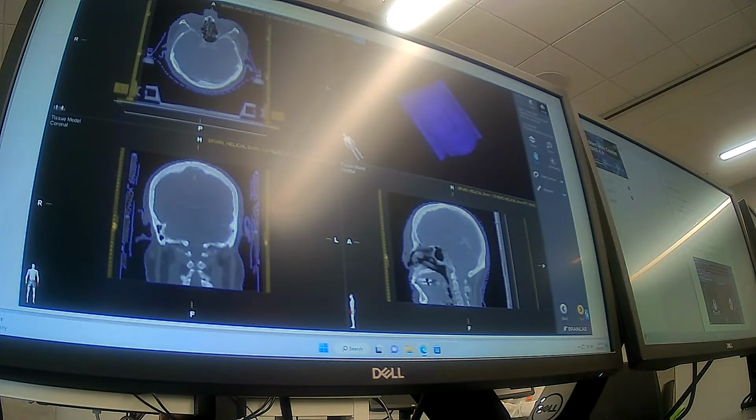And since it said here to exclude the localizer box, is that just, like, you're probably not going to see it on there. I assume it probably didn't pick it up. Did it pick it up? I mean, once I cropped it, then, yeah, there you go. Okay. They don't actually use the localizer box a lot in the newer treatments. In the older ones, there was a localizer box. So that's probably in the data.